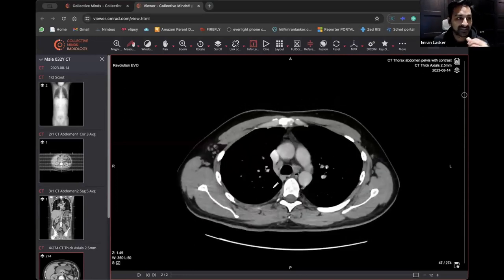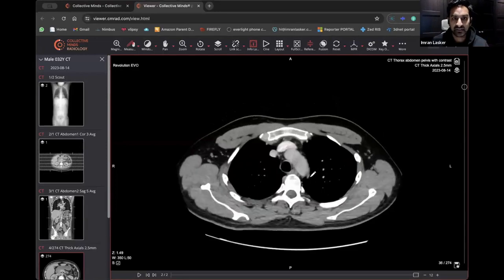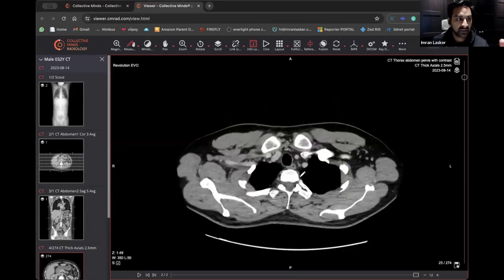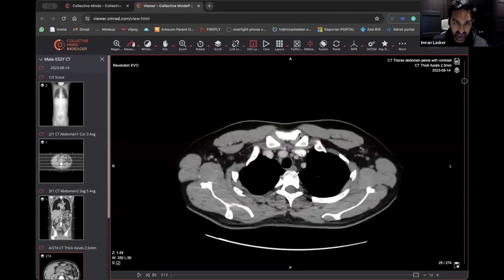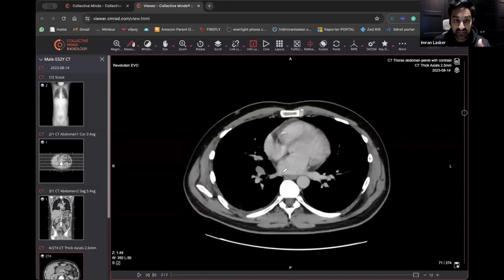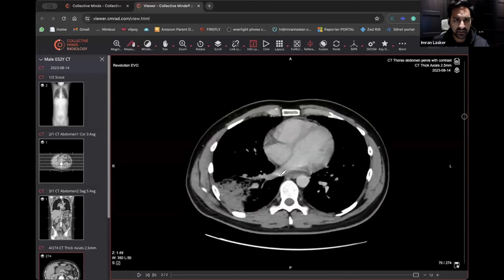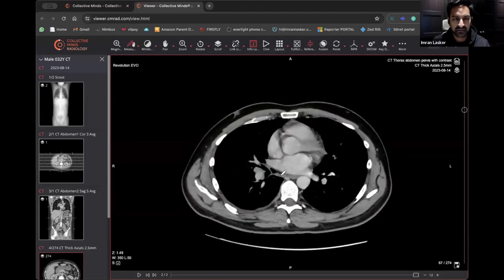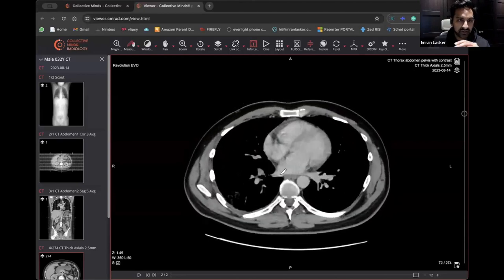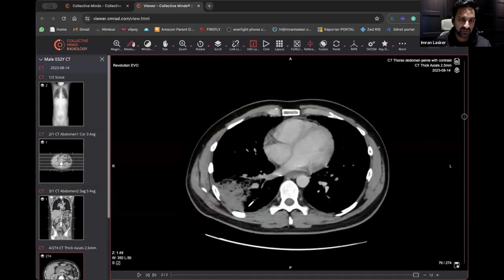But one thing that goes against this being a PE-induced issue, because I guess a PE could cause consolidation because of ischemia, is the fact they've got so many enlarged lymph nodes, right? So you can get infarcts, but the fact this person's got a few enlarged lymph nodes, and on this particular phase of imaging, I can't see a PE anywhere. If you do see one, do tell me where you think it is, and I can try and take a look. But based on the imaging that we've got in terms of lymph nodes and the consolidation, I would go for infection over anything else.